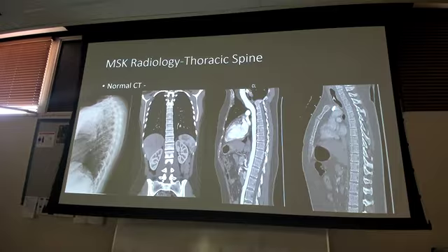Good. What are these guys? Kidneys, liver, spleen, yay. More block 2, but good to know where we're at, right? So there's your thoracic vertebrae. We'll do a CT on a lot of the stuff. We gave contrast to this patient because the aorta is highlighted and so are the kidneys. So you can tell there's contrast. If not, they would all be the same density, the same gray color, right?